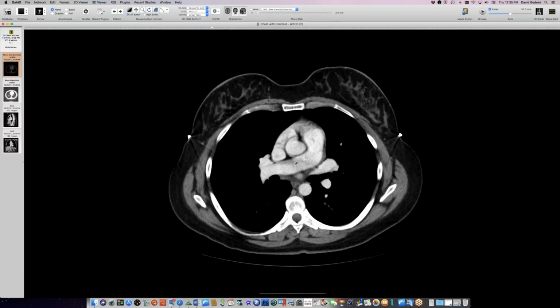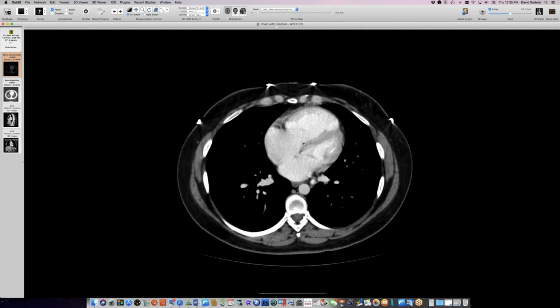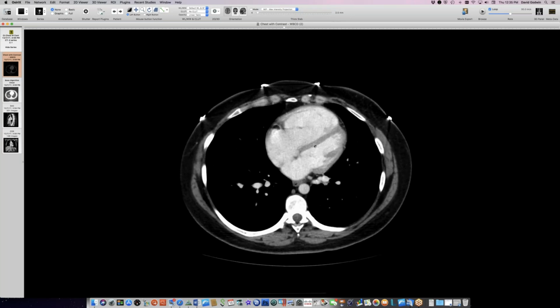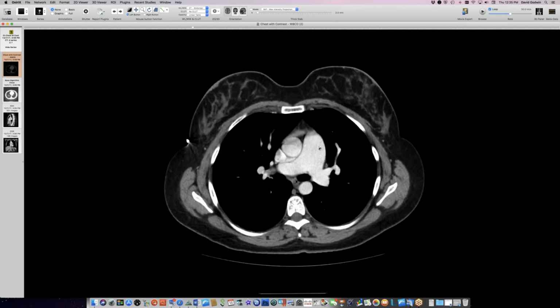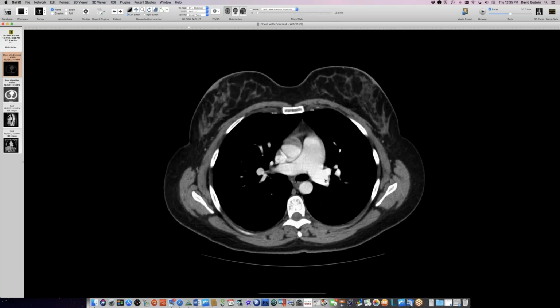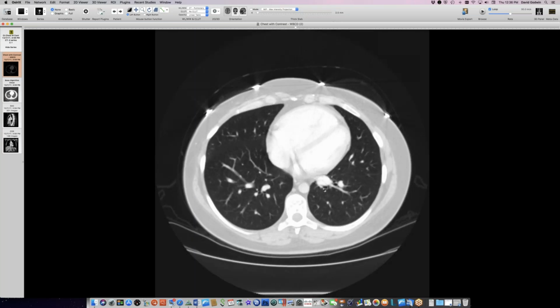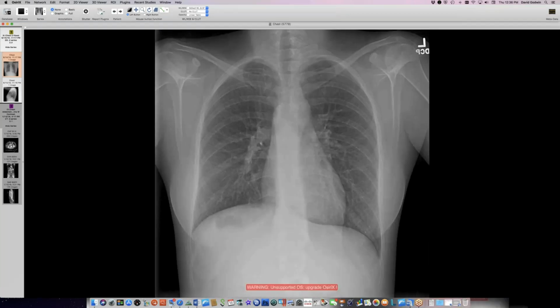Okay. And that was also documented echocardiographically too. Yeah. So this upholds Kanne's law. Absolutely right. The vessels were juicy, and I think there was mild pulmonary hypertension, if I recall the echo correctly. I'll clarify that when I post this case. But the central pulmonary arteries here, this is big. You were absolutely right, and the left pulmonary artery is big too. It wasn't just rotation; it was real. Yeah. But it follows Kanne's law. Then we have two congenital abnormalities with the systemic arterial supply and the ASD. That's right. Kanne's law rocks.